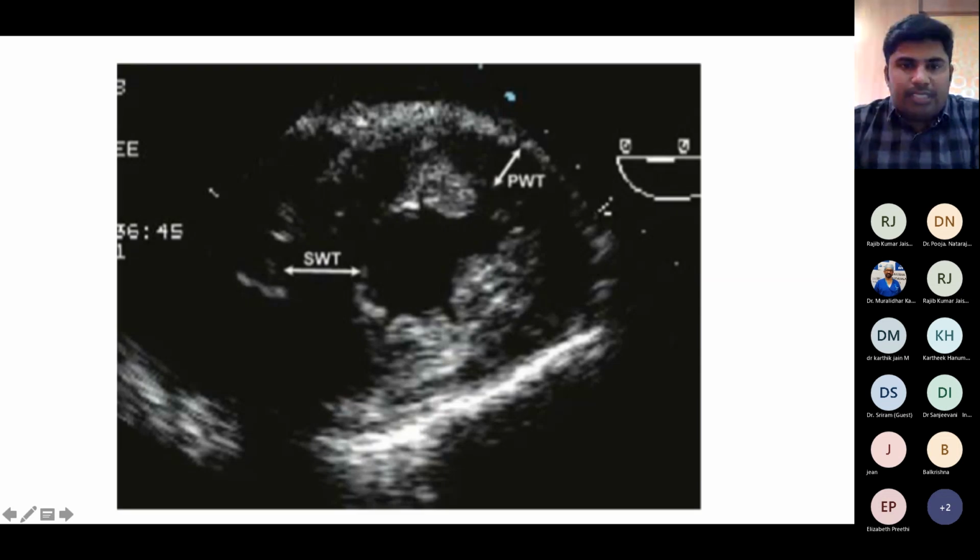For measuring septal wall thickness, it is better to use the transgastric mid-papillary short axis view. The measurement should be done at end diastole. Posterior wall thickness can be measured from the epicardium to the endocardium. Similarly, the septal wall can also be measured. This is useful where there is symmetric hypertrophy of the left ventricle. In a situation where there is asymmetrical hypertrophy, midesophageal views can be used. The midesophageal long axis view or midesophageal five-chamber view can be used to visualize basal hypertrophy of the septum.